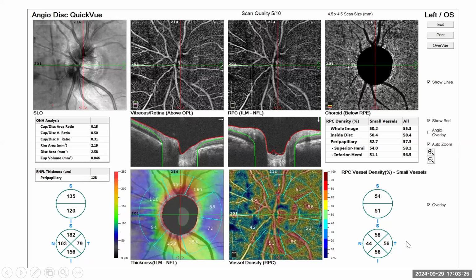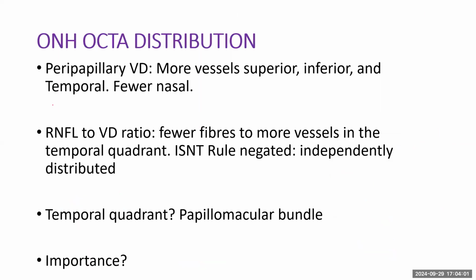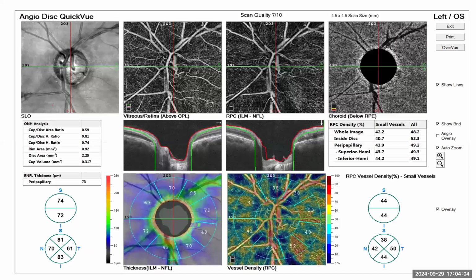Okay, so usually in the aspect of glaucoma that we talk about, the inferior and superior quadrants are usually the more assaulted ones, and that could be attributable to them having more fibers to fewer vessels. It means that for each vessel, for each capillary that drops out, more fibers will be affected, okay? So that also brings into account why they are more affected and why the temporal quadrants seem to be more resistant. Okay, so I've put some more images for us to look through.